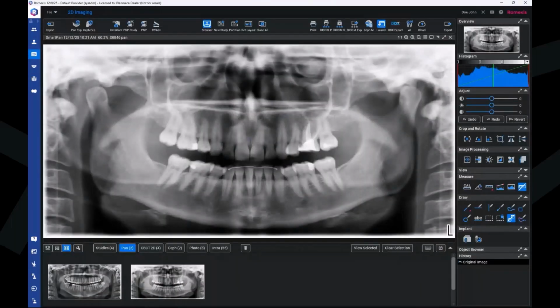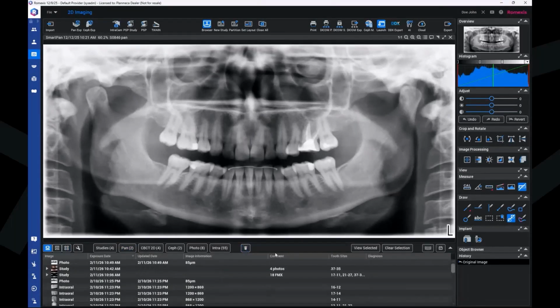Okay, then a few things, also still smaller things. There's also one thing that you can configure that might be helpful sometimes: this is a configurable option. You can have the inactivated images category here. Romexis always saves the images even though they have been inactivated from here, and those are saved, but they are behind the system administration logins.